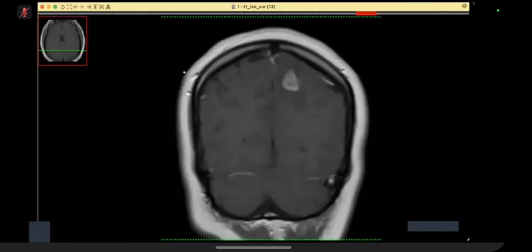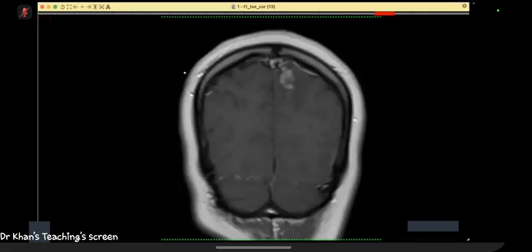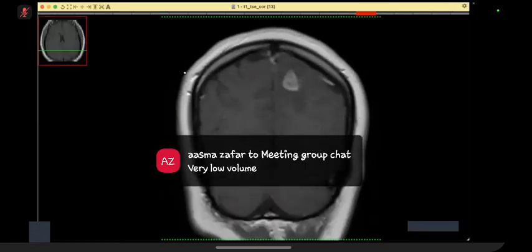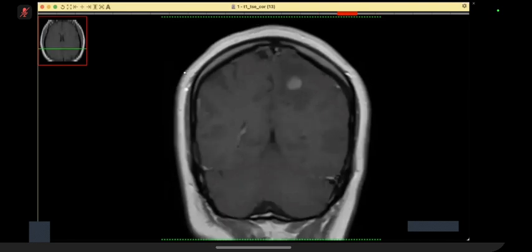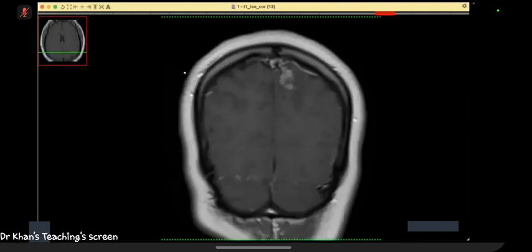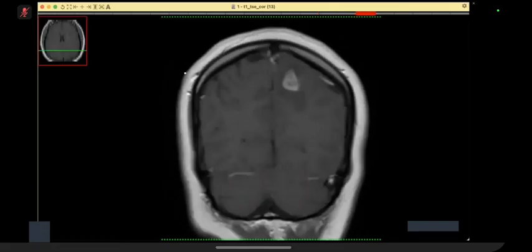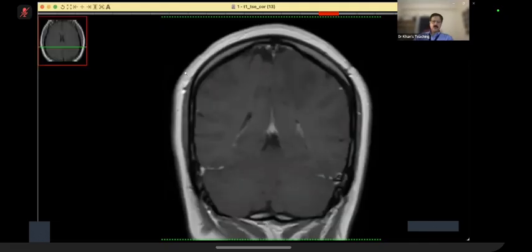My other thought, for enlarged mediastinal lymph nodes as well as abdominal lymph nodes, was TB, but the lung window is clear. Also, I can see the basal cisterns are non-enhancing, at least here. I'm trying to link the whole thing up. Very good, very good. Well done. Good thought process.